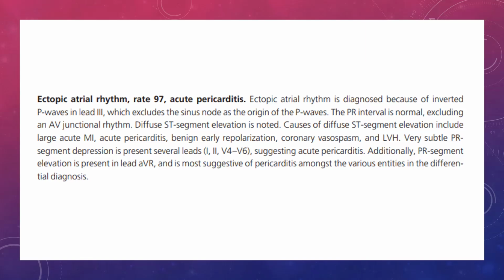And I just wanted to get to the answer on this because, okay, listen, I was lucky. I get to see the answers before, so that's why I could say it's an acute pericarditis. So I am cheating. But it's not because I'm extremely clever, it's just that that's the only way to put the presentation together.